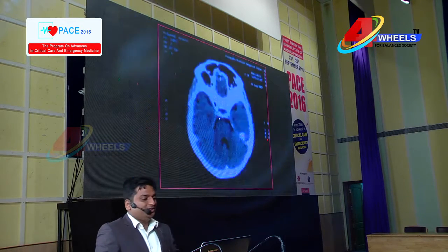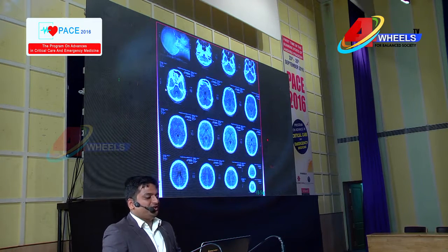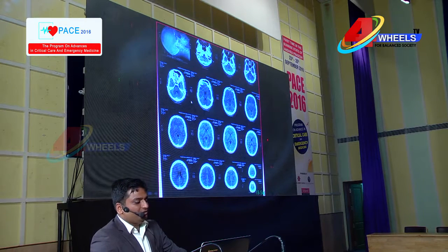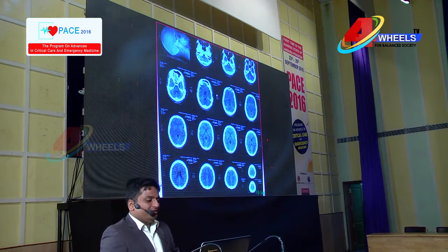So once you identify this moustache, where is your moustache here? Can you appreciate a moustache appearance here? So as you go up, we need to focus on the midbrain.